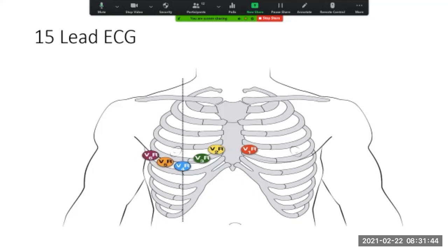Okay, guys, so I hope we understand that. There are others, but for now, we'll just keep it to this. What we do also when we get an ECG tracing, I want you to notice how it's been marked. It's been marked V1R, V2R, V3R, V4R, V5R, V6R. The reason being that on the ECG paper, we'll still say V1 to V6. We just write a little R next to that so that somebody looking at it understands what we did, and they realize that we are looking at the right-hand side.